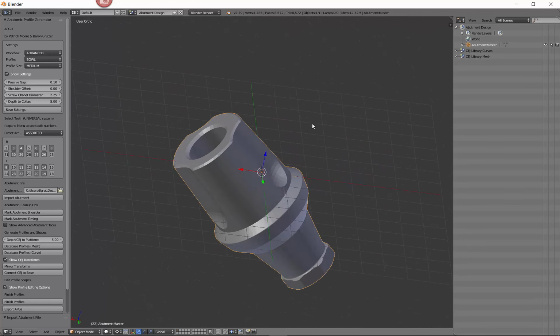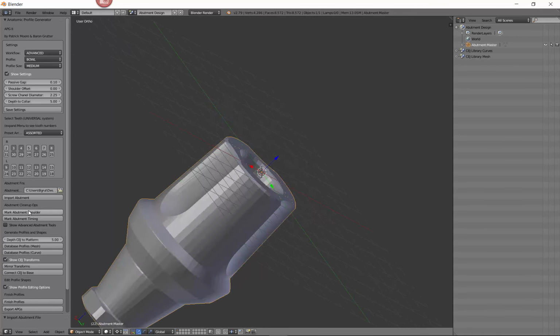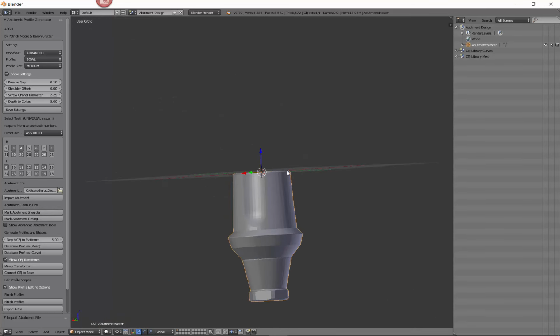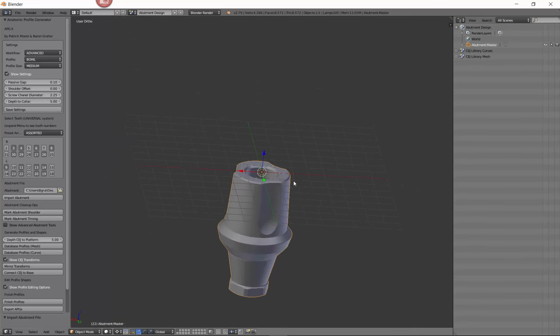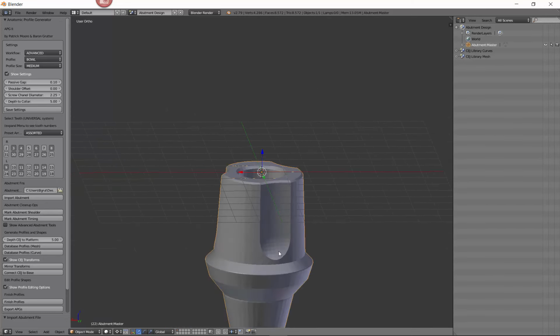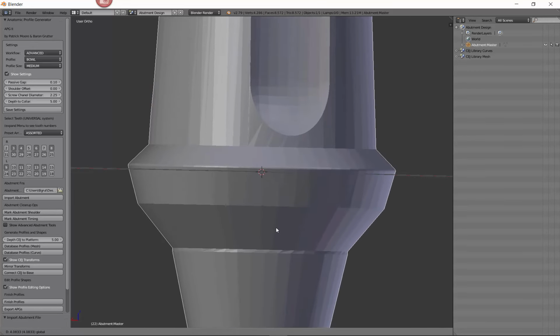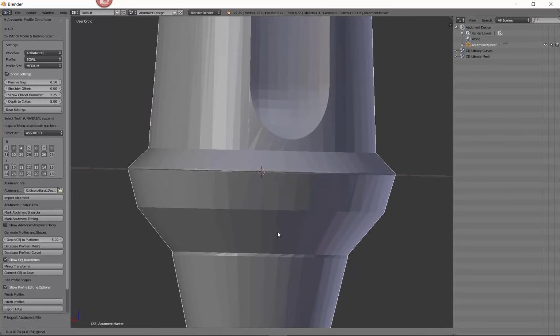I need something flat. So I'm going to go right to the top of it. I'm going to click there, and I'm going to say Mark Abutment Shoulder. And voila, it's right where I need it to be. Okay? The only problem is that's not my shoulder. My shoulder's down here. So I'm going to simply grab this blue arrow, line this up, so this is sort of a flat line, and I'm going to drag it upward, okay? Right until I see that margin line up with there.